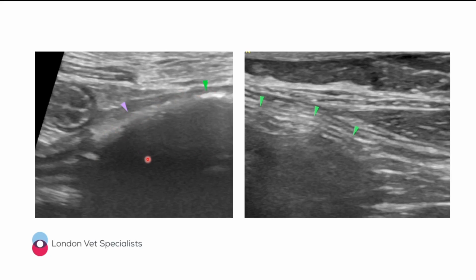If we look at the image on the right, we can see that this isn't small bowel at all. This is actually colon. So the colonic wall is much, much thinner than the small intestinal wall. And even though it has the same layers as the small intestine, these layers are much harder to see. So this is colon, no question. If you compare how the wall layering looks here to how it looks here, they're very different.